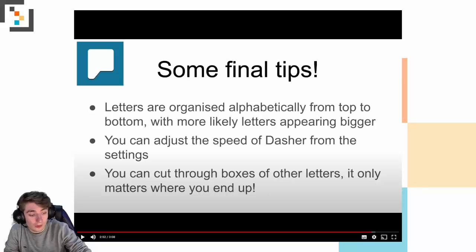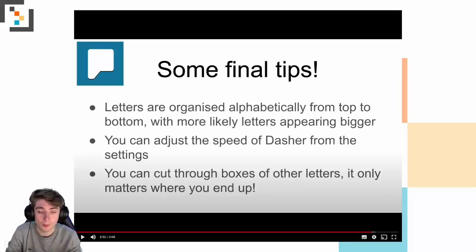So our goal here was to firstly replace the Predictable keyboard with Dasher as a text entry method, but we also wanted to keep the features and buttons that Predictable users will be familiar with.